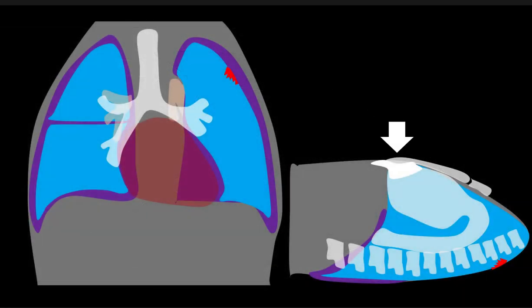So what you're going to look for is a blacker or darker upper quadrant in the abdomen. This is actually a little easier to see on the right because we've got the liver there, but you can also see it on the left. That's going to be the air collecting at the base of the lung, like we showed on the prior slide of that cartoon. You can also sometimes see a sharp outline of the dome of the diaphragm, because that air is giving an interface, a little bit of contrast there.